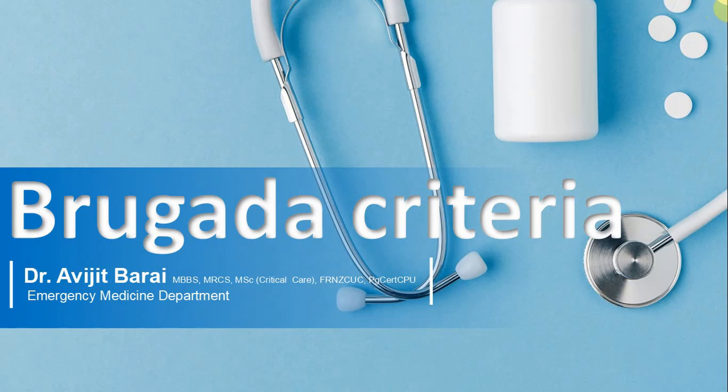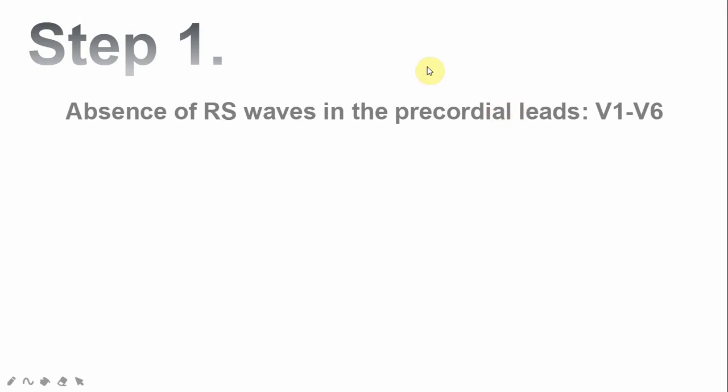So let's go to the business. The Brugada criteria has 4 steps. The very first step is the absence of the RS wave. You know that in the ECG there will be a baseline, and anything above the baseline is an R wave. Anything below the baseline is either an S wave or a Q wave. If you cannot differentiate between the R wave and S wave, meaning there is either a purely positive deflection or a purely negative deflection, then it is highly likely that this is VT, and you look for this specific criterion only in the precordial leads V1 to V6.